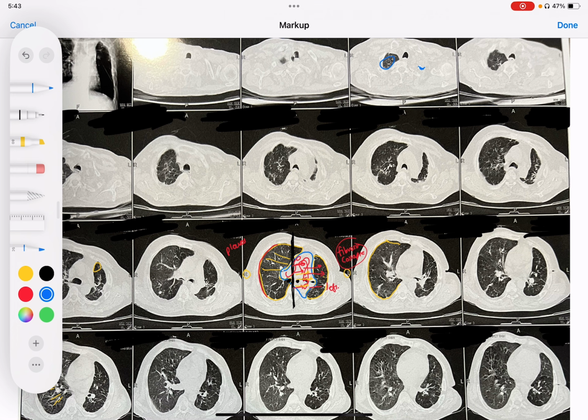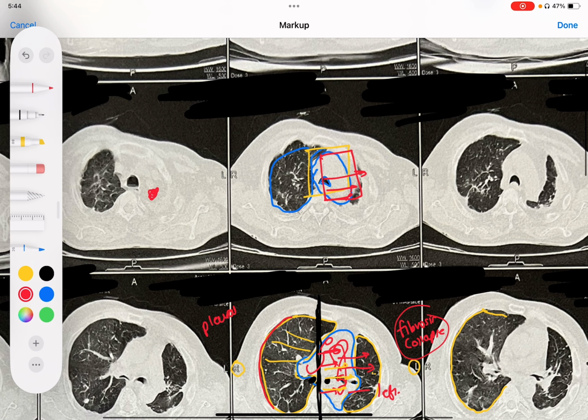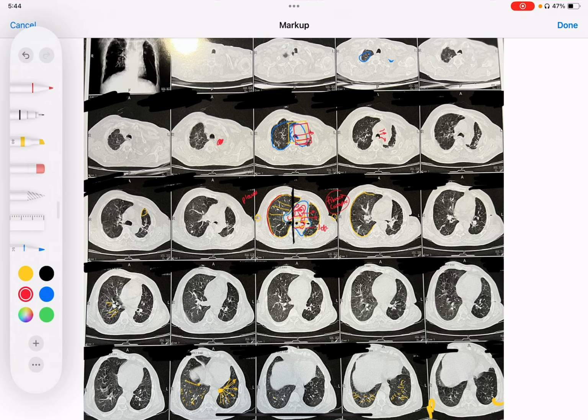So whenever we say it is fibrosed, it gets crumbled. So it automatically pulls the tissue which is present here. Here also we can see the right lung. This is the central trachea, and just see this is all part of mediastinum, which should have been actually here, but it is actually here. So it is all pulled toward the left side. This left-sided fibrosed collapsed lung is pulling not only the mediastinum but the trachea toward the left side.